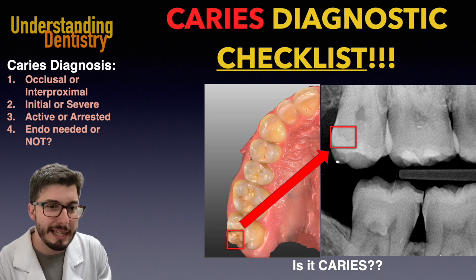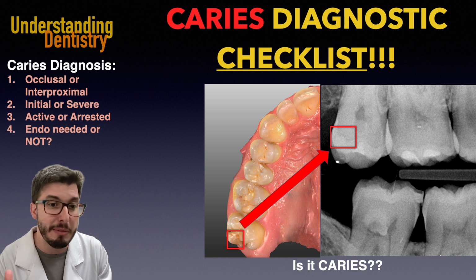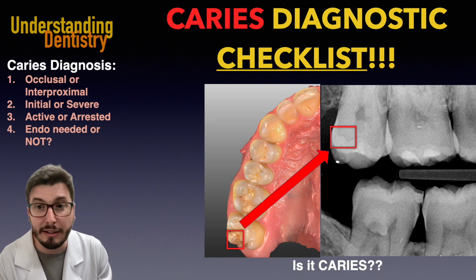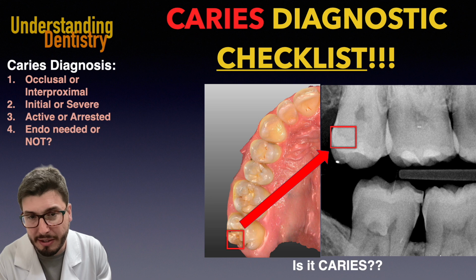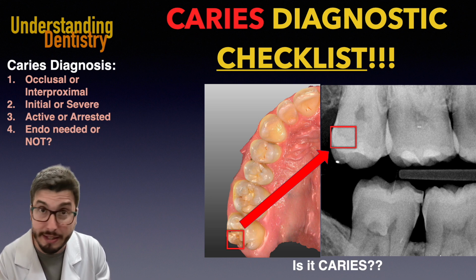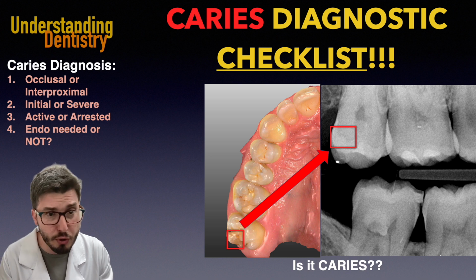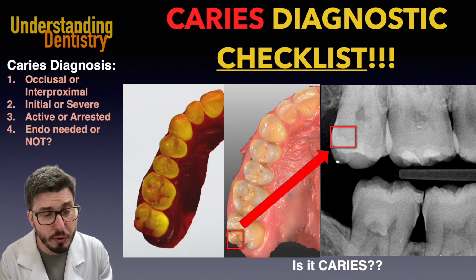Of course, you guys realize that instead of clinical images, we are showing intraoral scans because that's the digital impression of a patient, and even the intraoral scans can be used to detect caries. There is already research on that, but there's also the fluorescence images like this one. I'm going to show one of this case now to you guys.